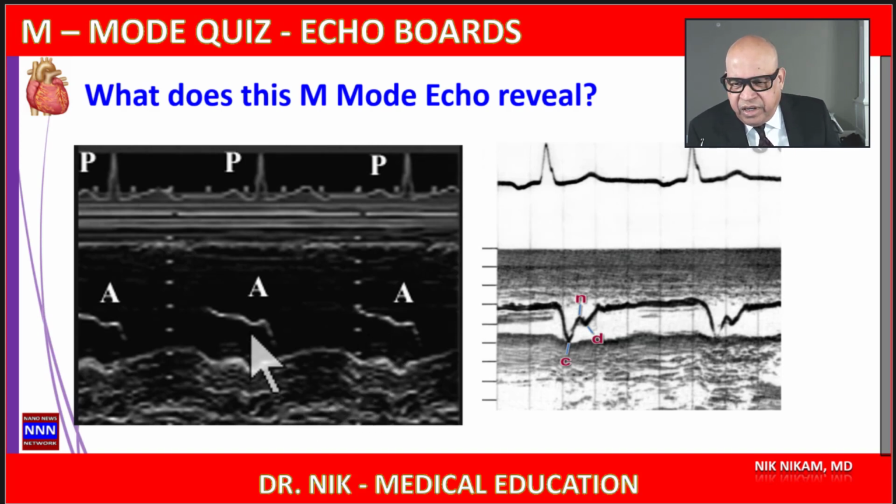Anyway, here we see an A dip, which is a normal variation. Some of the abnormal variations that we can expect to see in patients with a pulmonic valve would include, one, pulmonary hypertension. In patients with pulmonary hypertension, there is absent A wave along with some midsystolic notching of the pulmonic valve, which produces what is called a flying W sign. And when you see this one, this is suggestive of pulmonary hypertension.